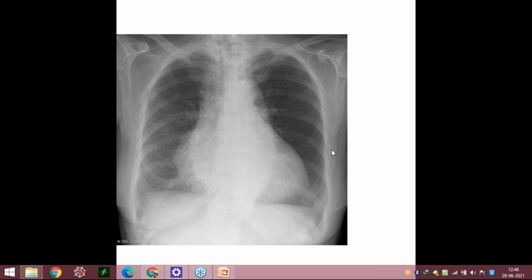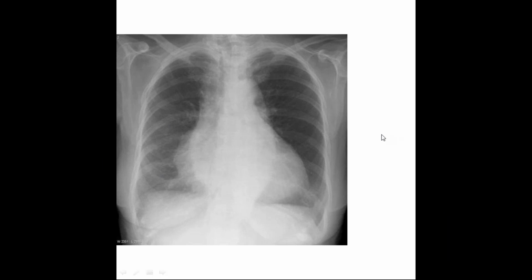Okay, so thyroid, we are talking about this X-ray only. Yeah, thyroid. Okay, thyroid for cannonball, it is unlikely. Thyroid malignancy usually does not present as cannonball. Okay, now coming on to this X-ray.